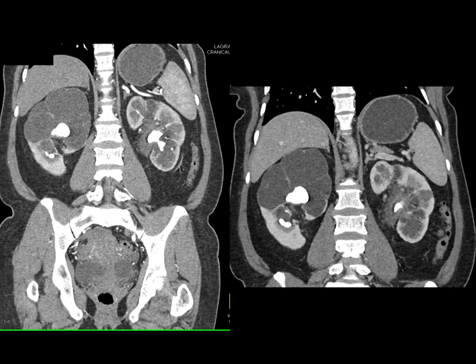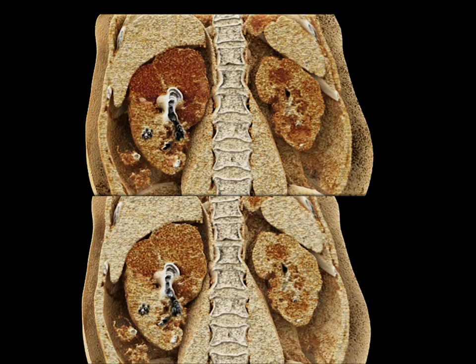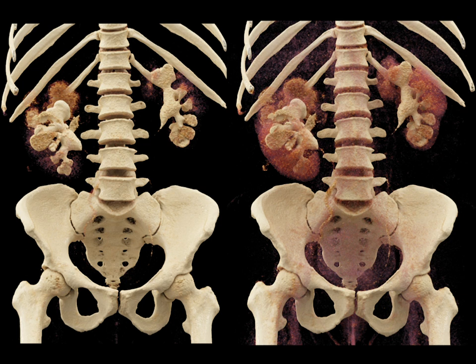Now with XGP, sometimes, though rare, it can be focal XGP, only involving a portion of the kidney. In this case, the lower third of the kidney is functioning, though there is stranding around the left renal hilum as well. And here the perfusion changes shown very nicely on the cinematic rendering. And here's the calyces, really well shown on the cinematic as well, with the dilated calyces bilaterally, but especially the loss of cortex on the right side, and all of the findings of the patient's XGP.